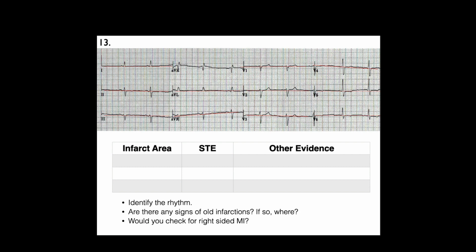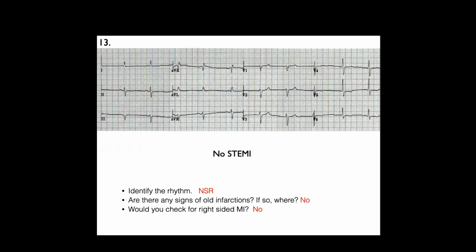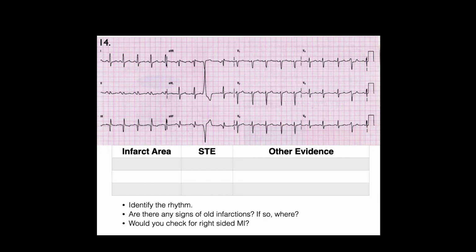ECG 13, normal sinus rhythm, nothing remarkable. Okay, good. Okay, next one. I said sinus tach with a PVC. Good.